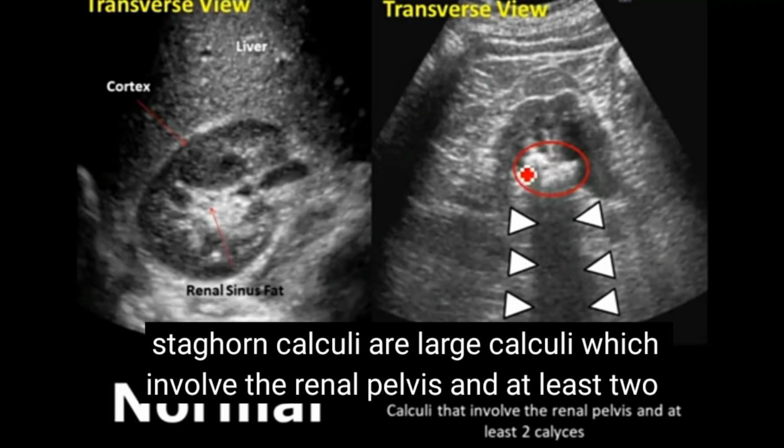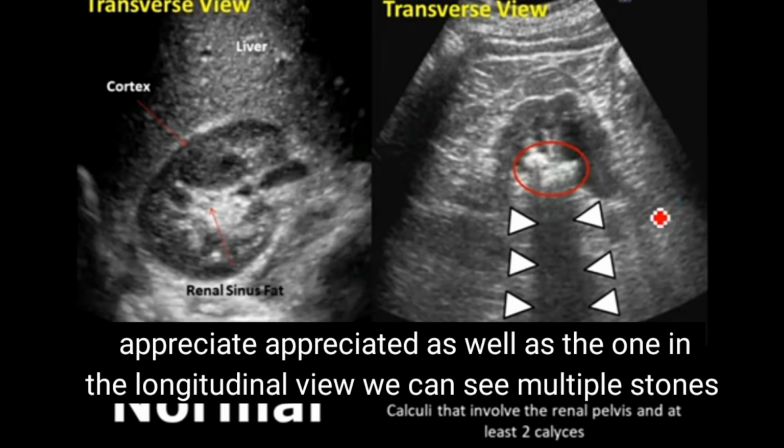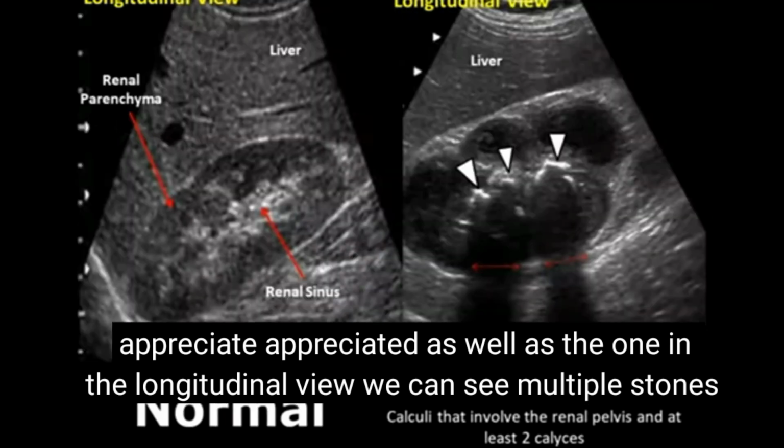Staghorn calculi are large calculi which involve the renal pelvis and at least two calyces of the kidney. These have heavier shadowing, but this is just a transverse view, so we cannot appreciate it as well.